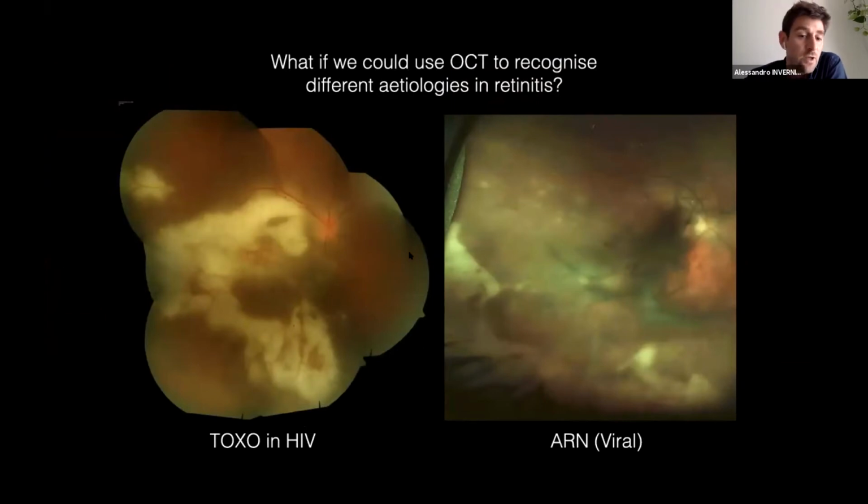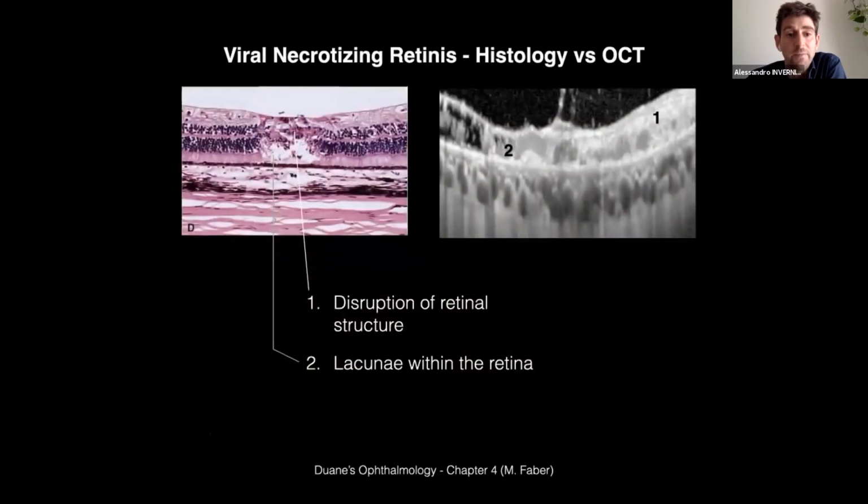Like in this case, we've got a patient with a toxo in HIV and a patient with acute retinal necrosis from VZV. If we compare the OCT of these 2 entities, and if we compare the OCT with the histology, you can see that they look pretty similar. So in viral retinitis, we've got a choroidal sparing, while the RPE and the retina are affected.